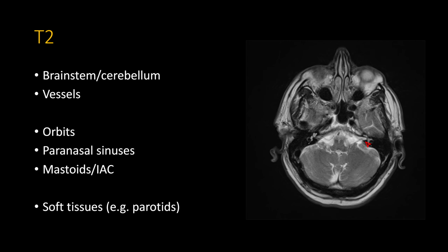Again, these are not high resolution images typically, so you can't say, oh, there's a tiny little schwannoma or something, but it's still good to get in the habit of looking there, because on occasion you will catch a bigger schwannoma that's occupying the entirety of the internal auditory canal, and it'll be completely effaced and pretty evident in retrospect, especially when you look at the post-contrast image.